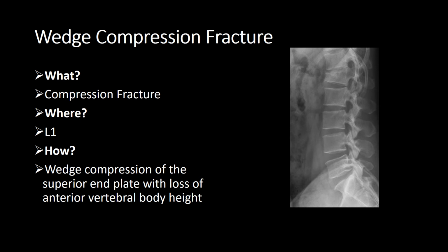So what is it? It's a compression fracture of L1, a wedge compression of the superior end plate with loss of anterior vertebral body height.